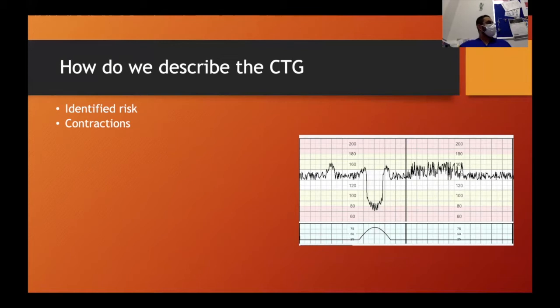A stable baseline, not quite a straight line. Okay, that was not very helpful. So how do you define what the baseline is? How do you calculate the baseline?